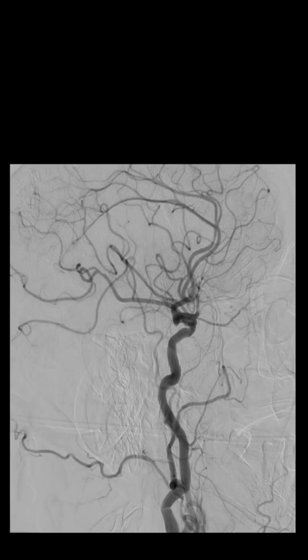Higher. This is the lateral view. So we'll try to identify the vessels. This is the carotid artery, and here you can see the ophthalmic and it dividing into branches. Lateral is mainly used for reading the anterior cerebral artery and its branches. Here you can see one anterior cerebral artery and you can see the opposite anterior cerebral artery.